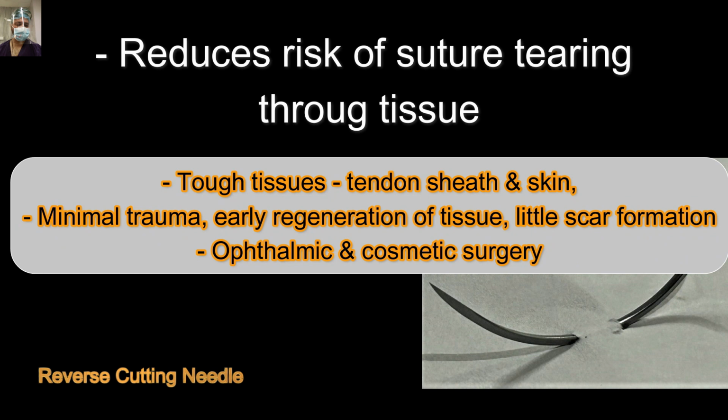This is the close-up view of a needle, and there's a triangular section of this cutting edge. It is not the whole length of the needle, only the last part, usually 1/3, where there's a cutting edge; the rest of the part will be a normal flattened surface.